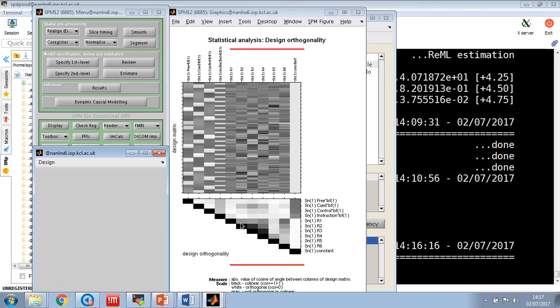Now, the other thing to remember, there's a little bit of correlation with motion here with the second condition, which is cued movement. Not terribly high, but it's worth bearing in mind that there's probably a little bit of motion confound in that condition. So it's one of the things you sometimes want to check, whether somebody's got some kind of task related motion.